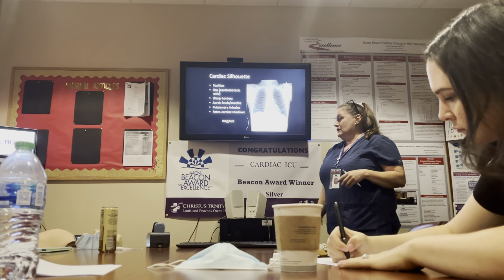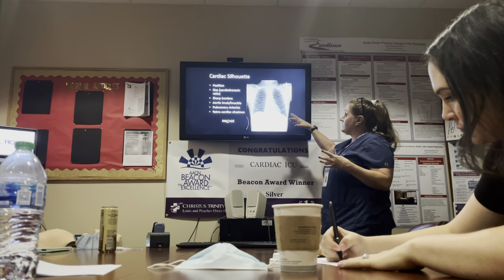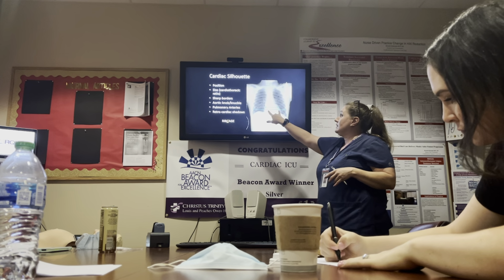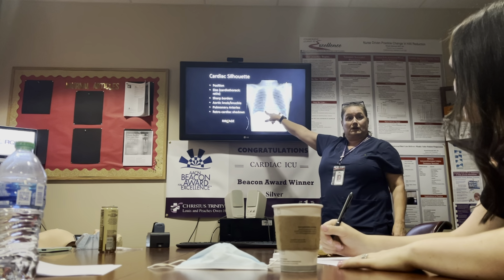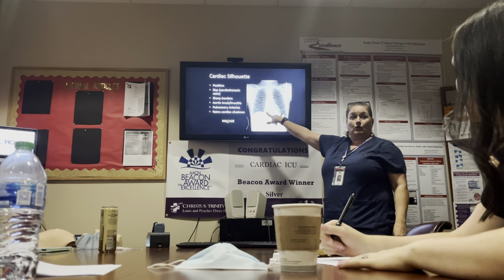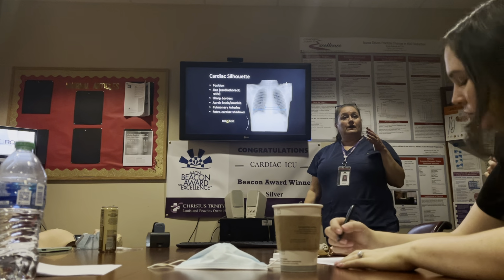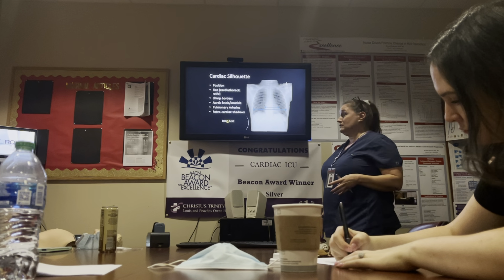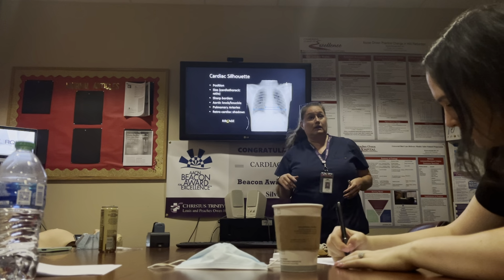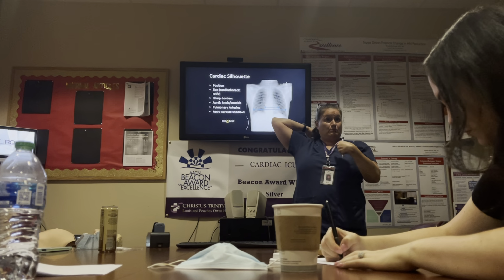So, C. At this point, you're looking at your cardiac silhouette. It needs to be midline from that aspect. What you guys oftentimes will see is that it shifts or that it's larger. It's going to be different on your PA and lateral than it will be on your AP films. Most of the things that we do, we shoot as a portable chest x-ray, so the plate goes in the back and we're shooting the beam this way.